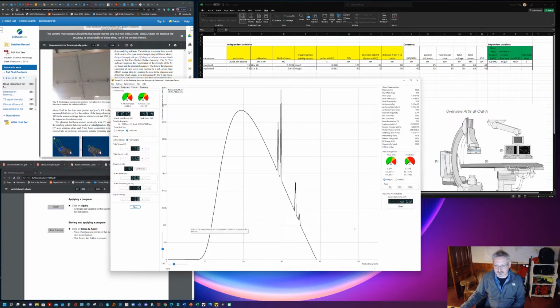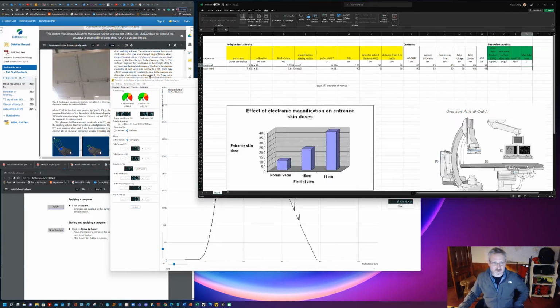So it's going to take 30 seconds, obviously, to heat up. So it's climbing, and we're heating the tube up. It's cooling down really quickly, so this is not challenging it. It's not going to get hugely hot here. As soon as it heats, it's cooling at the same rate, so it's just staying constant. It's just climbing slightly, 200 odd. So okay, there we have it. 214 degrees was the maximum. So we can put that.